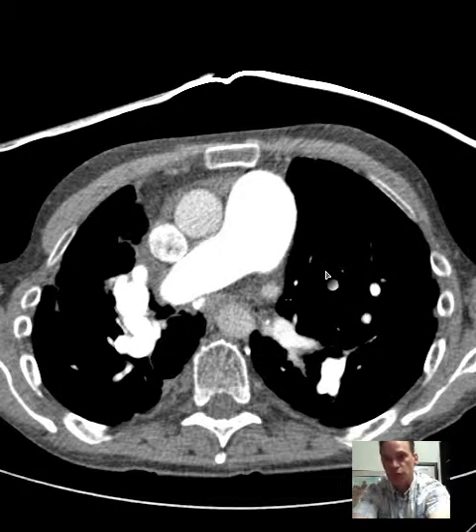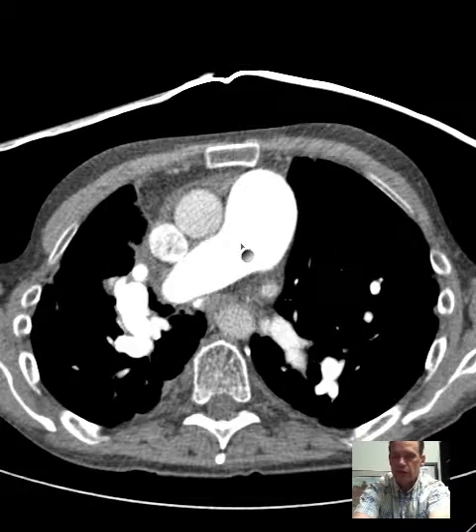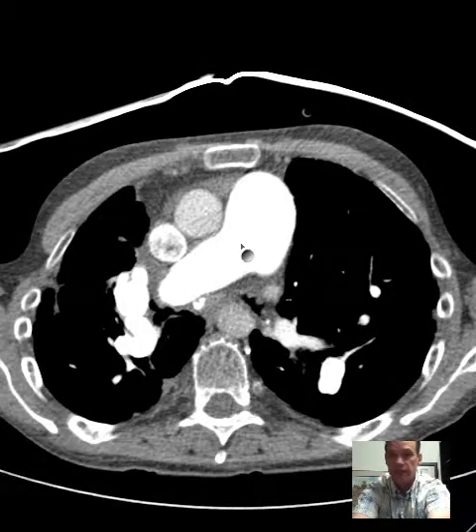In other words, pushing blood through the lungs and getting it back into the left atrium encounters a great deal more resistance. And so this enlargement reflects that increase in resistance, and that increase in resistance also produces pulmonary arterial hypertension, so they all are tied together.